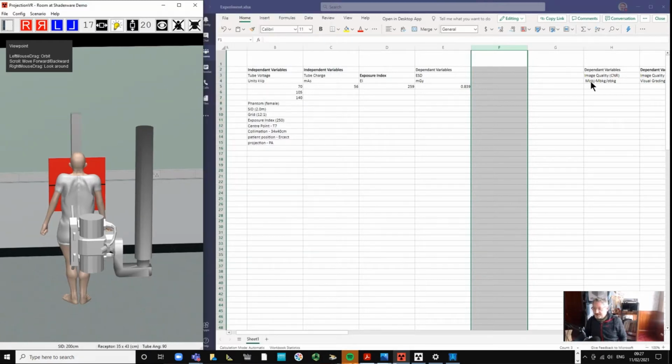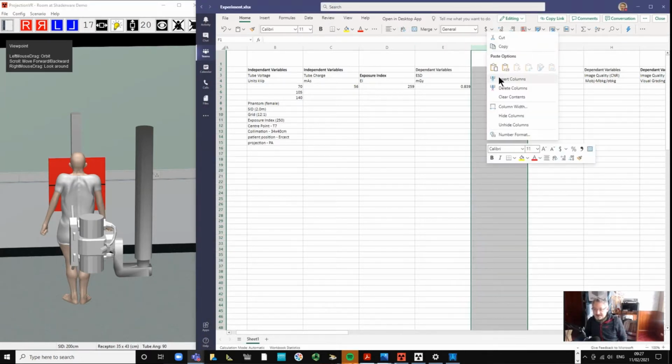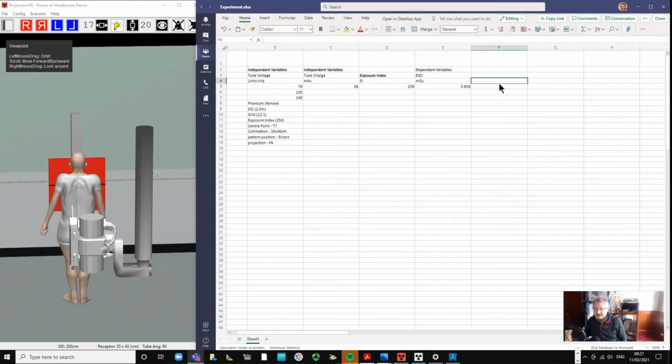I think we can't do this calculation here. So what I'm going to do is put all of the numbers that we've just captured in here as raw data, and then we can do the calculation. So the mean pixel value for the background: 1939.